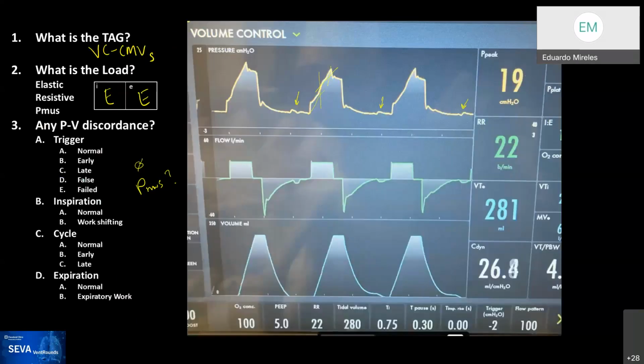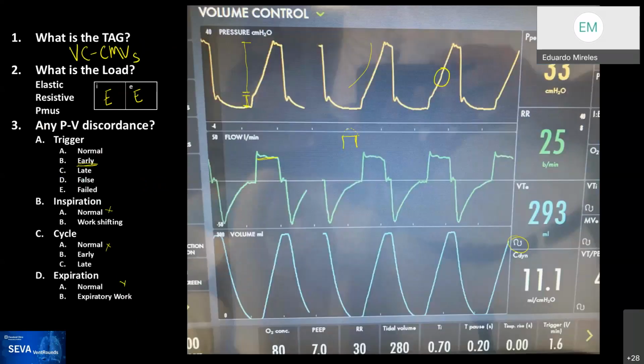So you can actually see the changing tidal volume exhaled, how it changed. The risk of turning off the compliance on a patient like this is that they will be hypoventilating, right? Because now the lung compliance is so low that some of that volume is going to get lost in the compliance of the circuit, so the patient would hypoventilate under those circumstances.